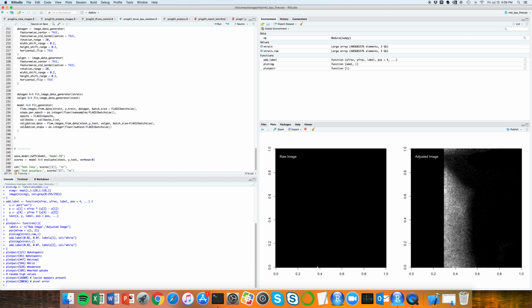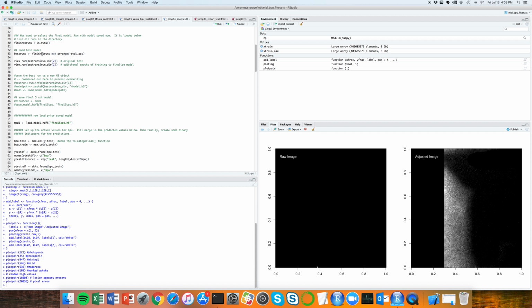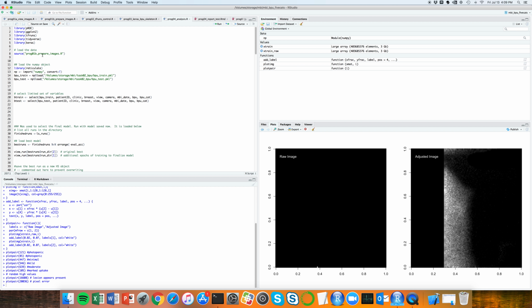You go through, compile the model, and you fit it. And one of the last steps is you can check the model performance on your test data. All of that, when it runs, it creates an environment that allows you to store all of the data from run to run. So one of the things I want to do here, we'll reload some of this. Actually, I'll just go here. I'll show you the output.